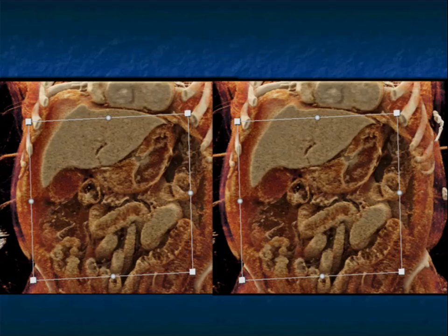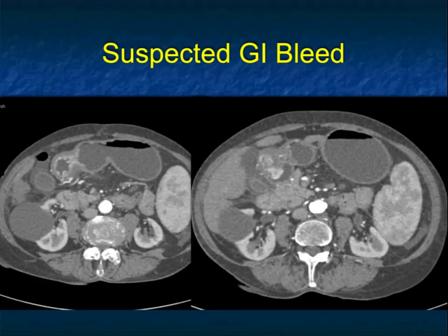So you can see that some of the newer techniques like cinematic rendering can really provide a lot of additional information that can help you detect the presence of ulcer, extent, and involvement, and at times perhaps be helpful in determining malignant versus non-malignant ulcer.